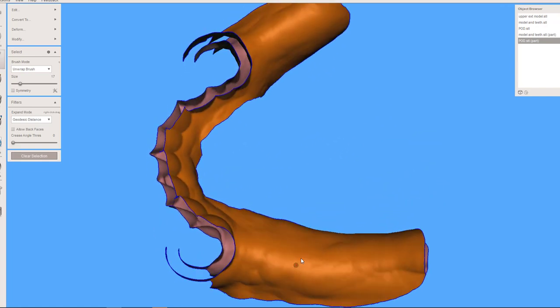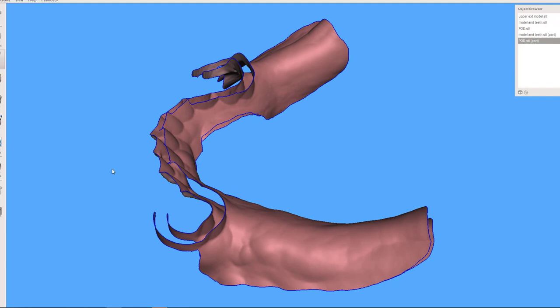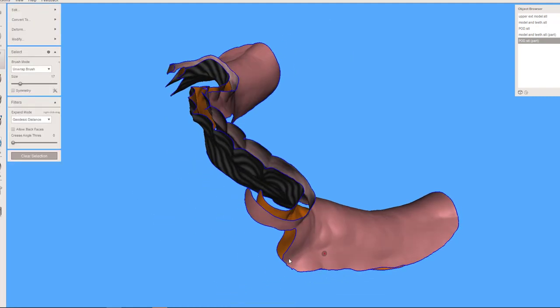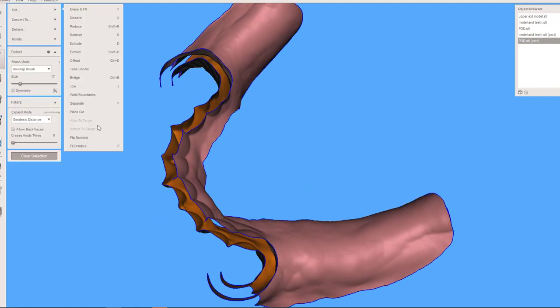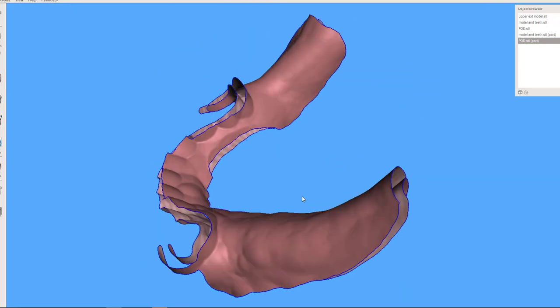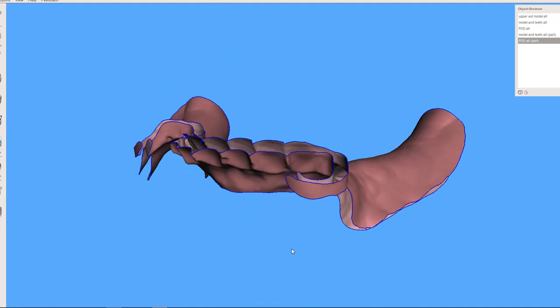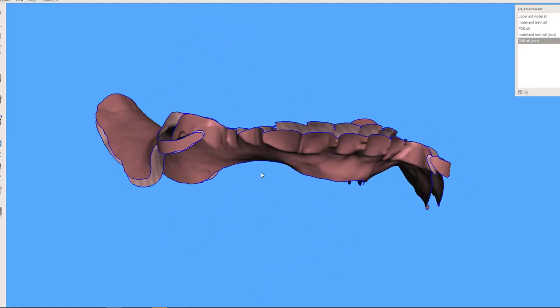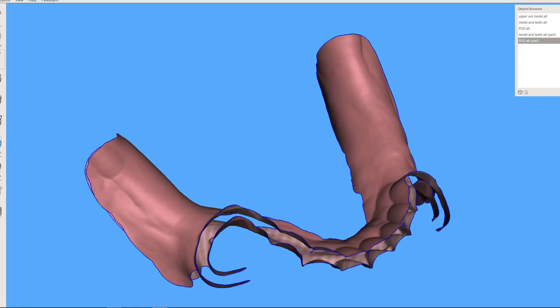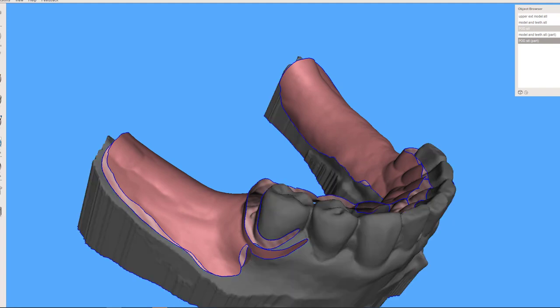So at the end, when we're ready to, we're basically going to take this surface right here, and it's going to have to be flipped inside out. So if I go to edit, flip normals, that's what we want. The mesh facing out, mesh facing in, and then we're eventually going to click the borders and hit J to join those. But I don't want to do that yet. And the reason why is I need to do some festooning on this.